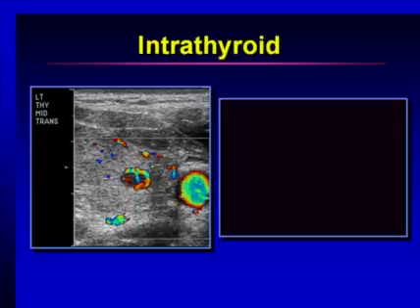The surgeons look for these. They tend to be quite soft, though. They're difficult for the surgeon to palpate. Fortunately, they show quite nicely sonographically from the remainder of the thyroid parenchyma.